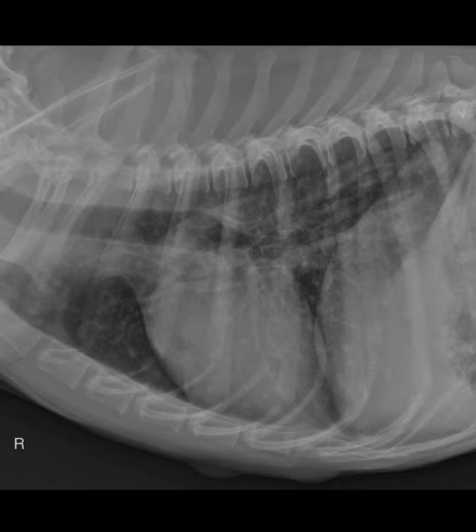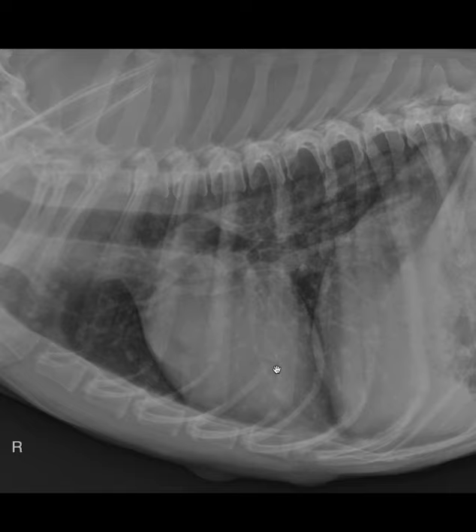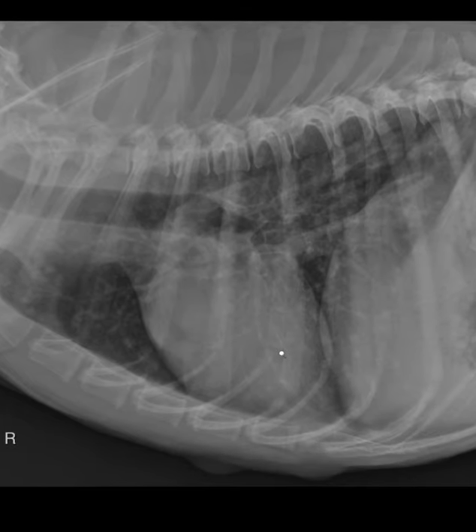This week's example is a 12-year-old mixed breed dog with some neurologic signs, summarized as T3-L3 myelopathy. It's a common scenario at both referral and probably primary practices. You often have to decide what you would consider to be baseline data before you go to a costly procedure, like, for example, in this case, an MRI. So it was elected for this patient to perform thoracic radiographs merely as a screening procedure prior to the MRI.